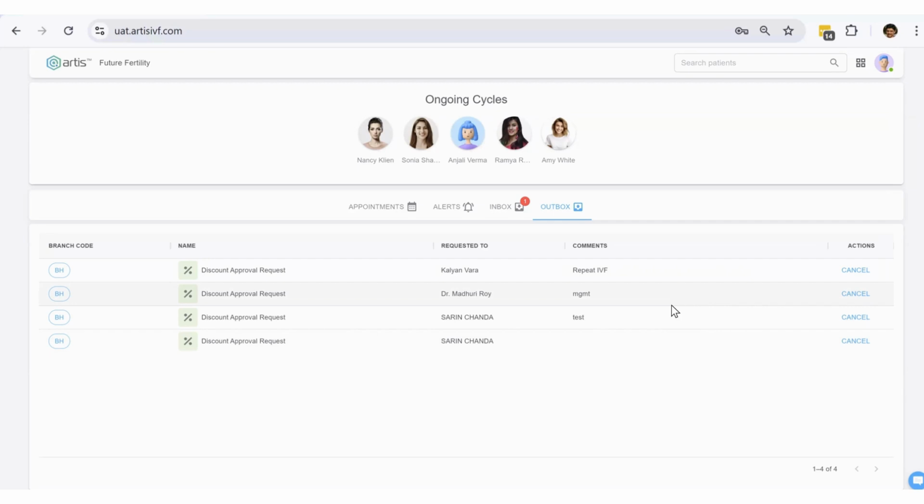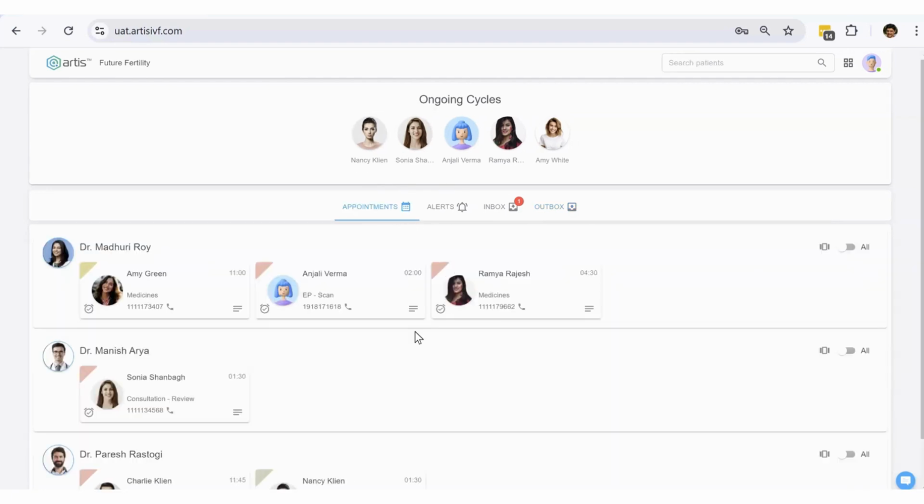So that essentially is the dashboard which every in-house user gets to see and then take actions depending on their profile. Now we will go to the typical journey of a IVF patient. I'll try to cover that maybe 5 minutes kind of thing, and then we'll take a deep dive into one of the case to capture or cover more aspects of their journey.